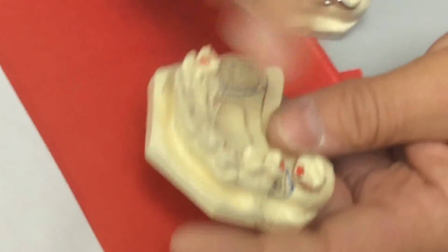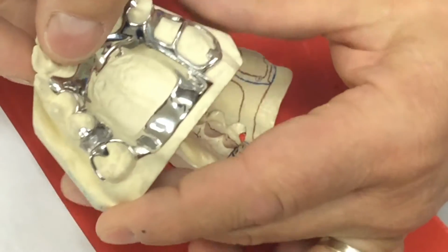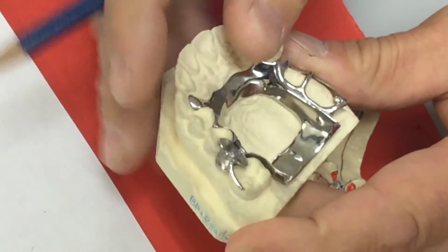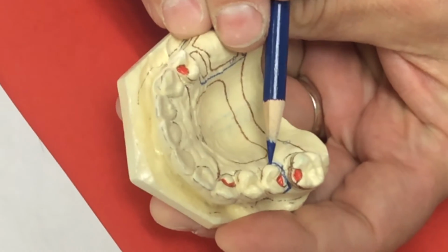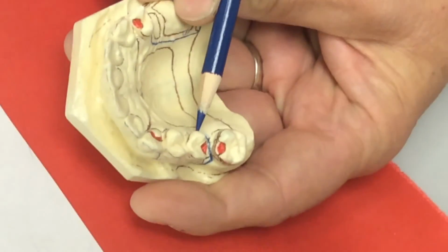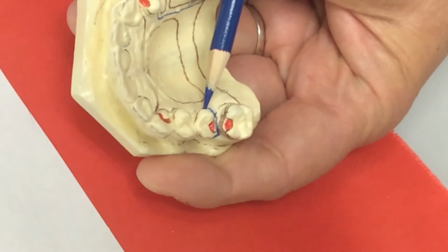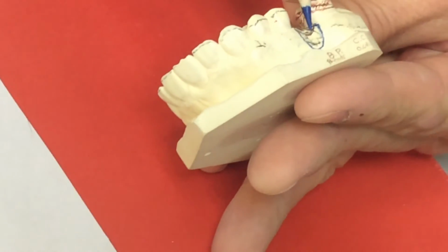Talk about this tooth over here. When you look at the metal for that tooth over here, it's recessed. It's a minor connector. So you have to show where it's going to end with the framework, which on this cast is the brown. Okay, you should show where it ends on the inside of the framework. It should have a finish line across here. And it should have a finish line which is brown here on the outside.